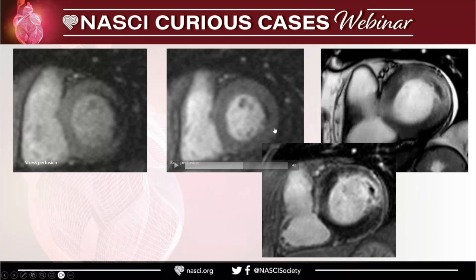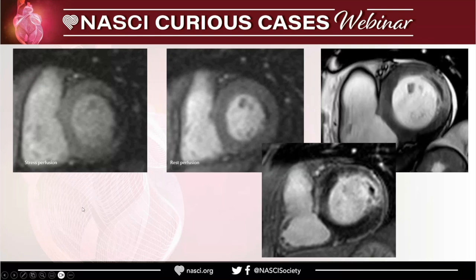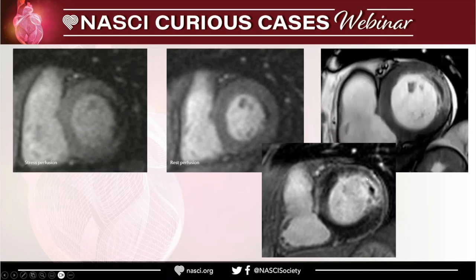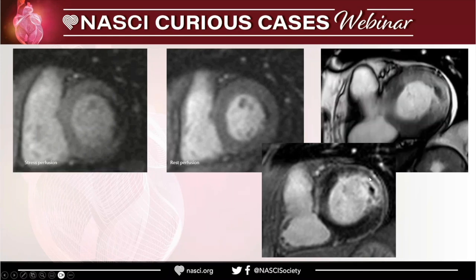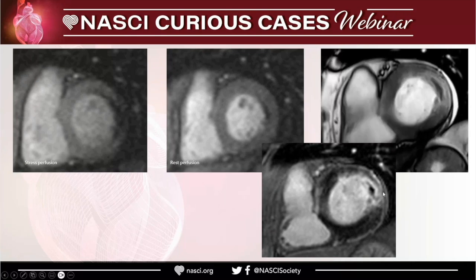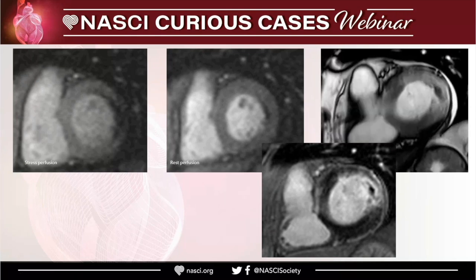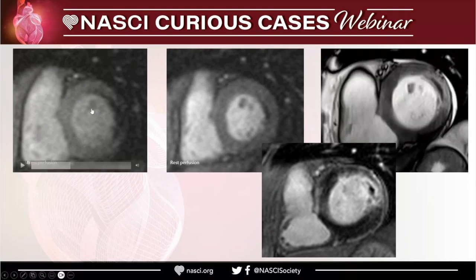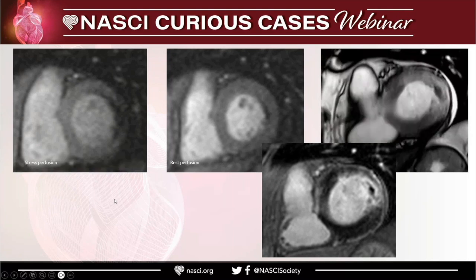So that is the problem with cardiac MRI stress and rest comparison. So I like to compare the stress with my delayed enhancement images. If it is not really an acute infarct, I will also look at the T2, then most of the time those areas will be scar, and then this will be peri-infarct ischemia. You guys agree or not?